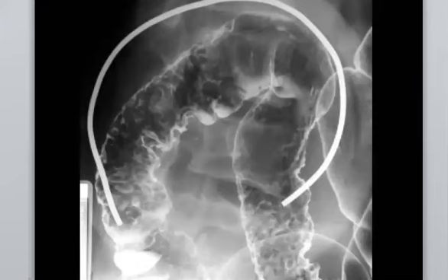This patient has a history of chronic ulcerative colitis, and he got remission. Yes. So what do you see here? Maybe, but already he has a history of ulcerative colitis, not Crohn's. So do you agree that there are multiple lesions that maybe denote that there is like a polyp? Yes, with this double contrast barium enema. So maybe it is a polyp.